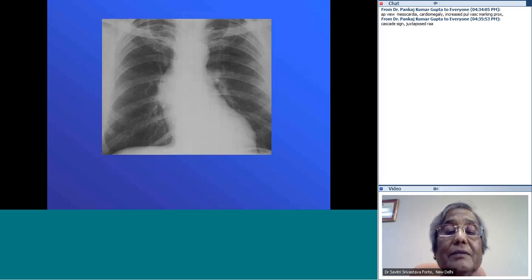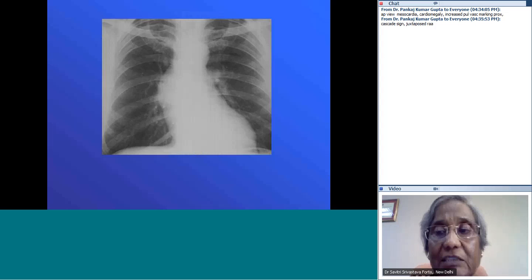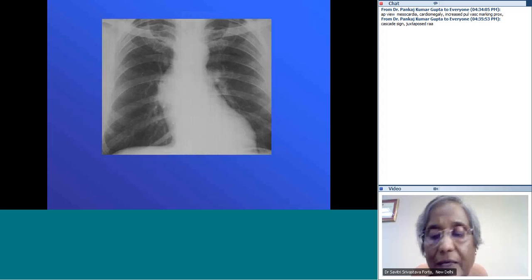Oh, I am getting only one answer, that is from Dr. Pankaj. There are no more answers coming. Why? This is an interactive session. There's supposed to be a quiz which is interactive, not a didactic lecture. So I'd like more people to answer it. Well, there is no answer, so I go on and I show what it does show.